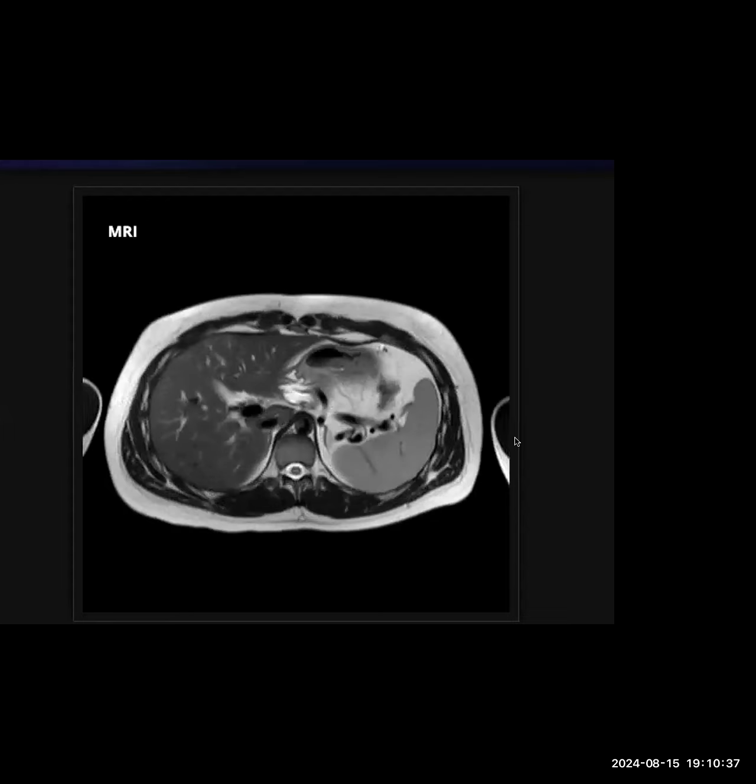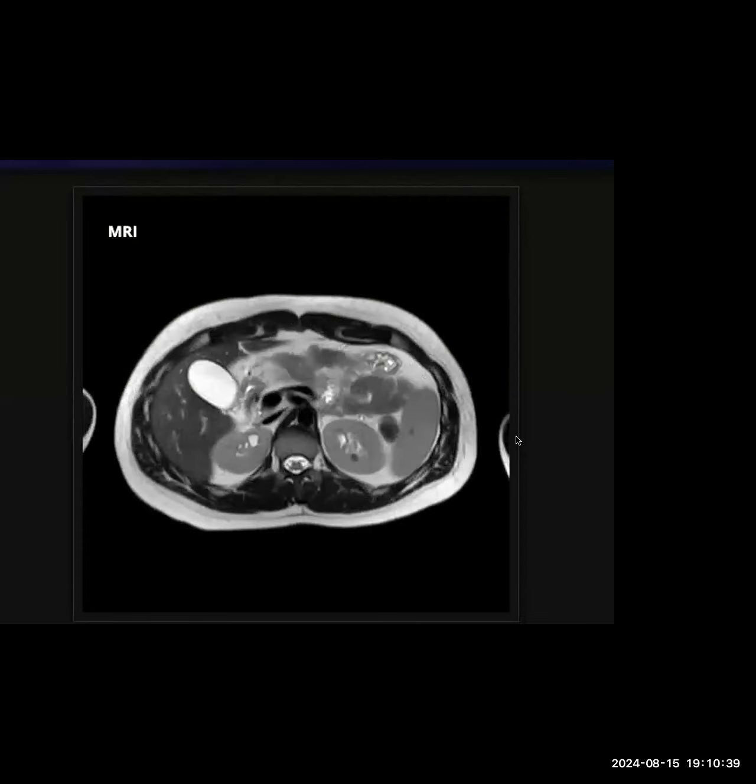So this case was a case of dorsal pancreatic agenesis. It's a rare variant that you can see sometimes. A common question that can come along with this is that these patients often present with hyperglycemia. And remember that in future, these patients can be prone to pancreatic tumors like solid pseudopapillary tumors. And like you said, pancreatitis can also present in these cases, and intestinal malrotations. So it was just a spotter case that I wanted to show you to see if you can pick it up.